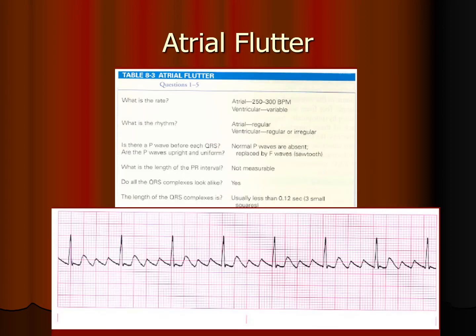So we can have something called an atrial flutter. This is when we're like, what the hell is this? Oh no. So we call this the sawtooth pattern. If you were to look at the side of a saw, like a hacksaw, you were going to cut down, I don't know, branches in your backyard, it kind of looks almost like the sawtooth pattern. It doesn't look normal, right? You're like, what the heck is this? So what's happening is the atria are spinning out of control.